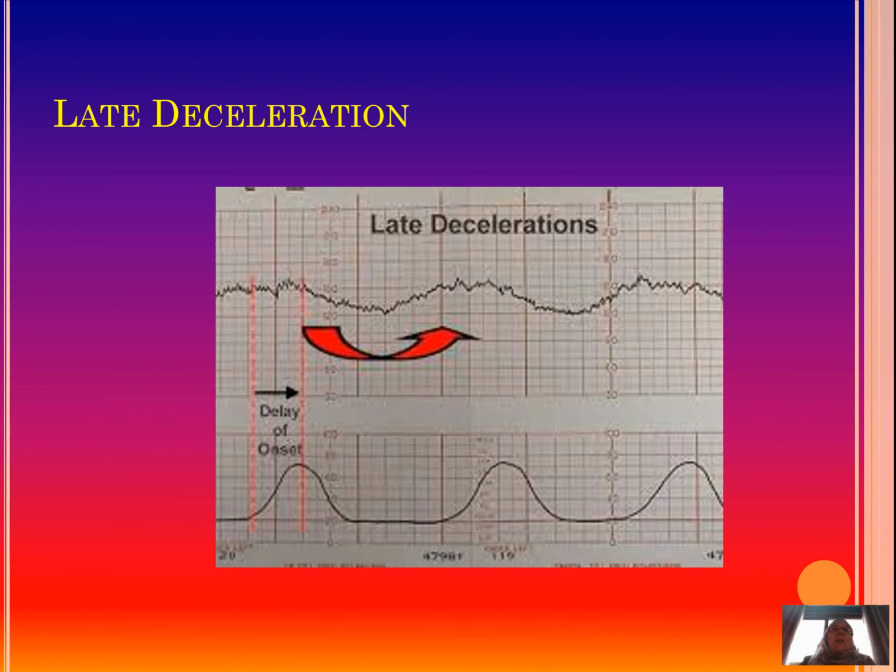Here's another CTG of a late deceleration, and you can see the deceleration is well behind the contractions. And again, you see late decelerations occur after every contraction.